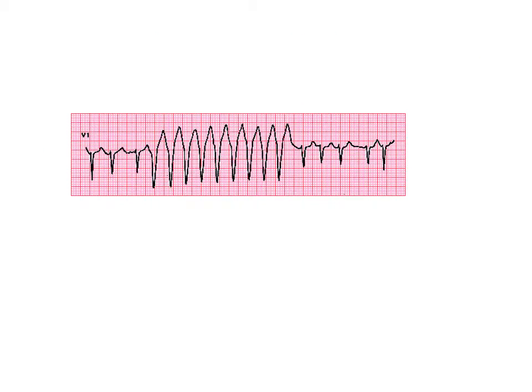All right, what about this one? Well, what I notice is right in the middle there's something different than at the beginning or at the end. These are really wide waves, so they're probably ventricular in nature, because the ventricle always has wide waves if it beats on its own or has a sudden beat, whereas anything above the AV node is going to be a small QRS complex. So I have small QRS complexes in 3 beats, and I have these big wide waves that are pretty equal in size, pretty equal in shape, and then it goes back to regular again.